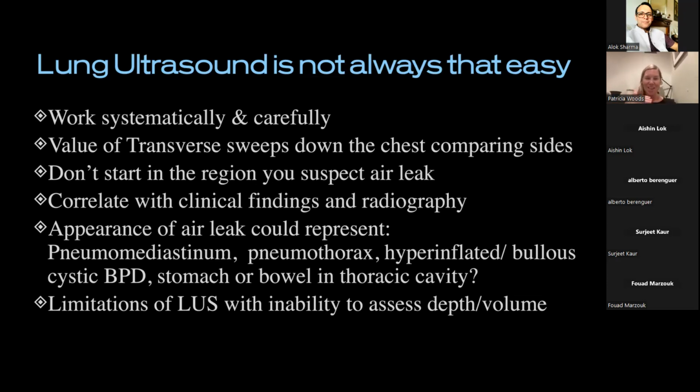Correlate it, all right? It's exciting, but just hold your horses for a moment. Does it make sense? Does it fit with the clinical picture, or is it cystic hyperinflation? Is it the stomach coming in? Is there something else it might be? Is it pneumomediastinum? One of the quick ways of looking at that is the lack of visualization of central structures. Just as with cardiac imaging, when it's pneumopericardium, you just can't get any views, and you're not visualizing the heart where you expect it to be. Is there something unexpected here, like stomach and that bowel signature you're observing in the thoracic cavity?